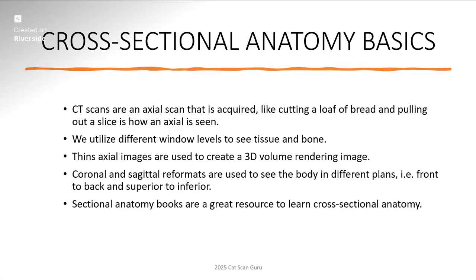Now, thin axial images are the data set we use to create our 3D volume rendering image. Those nice 3D vessels and the skull are acquired with axial images. Usually those are stacked on top of each other, so they're overlapped, per se.